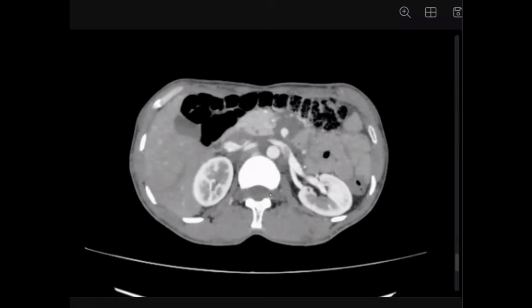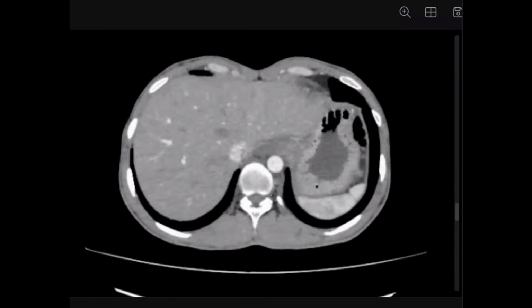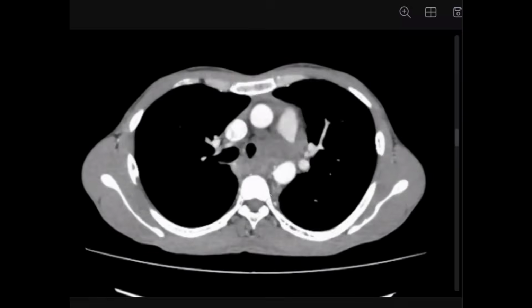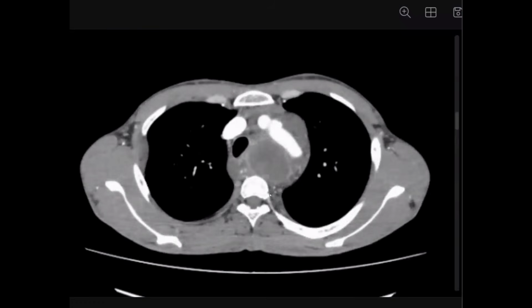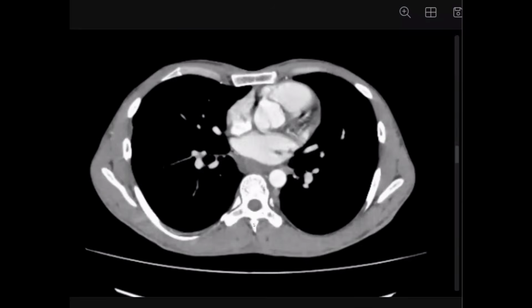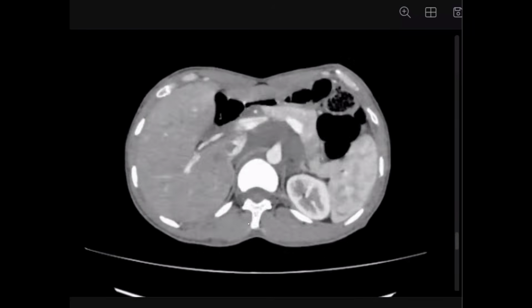Could be any infective cause like tuberculosis. Tuberculosis should be lymph nodes, maybe with central caseating, non-enhancing components. It doesn't look like this one, really. So another possibility for non-enhancing masses is lymphatic malformation. That would not be so extensive, but one of the masses shows marginal contrast enhancement. Maybe in our differential, but it's not typical really.